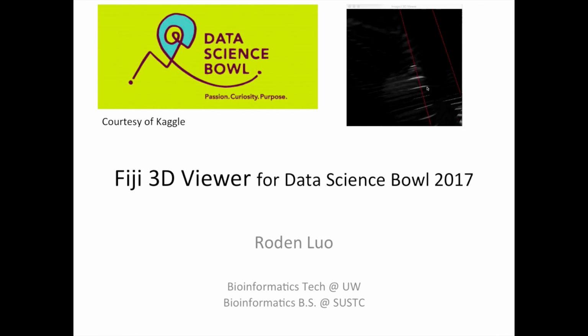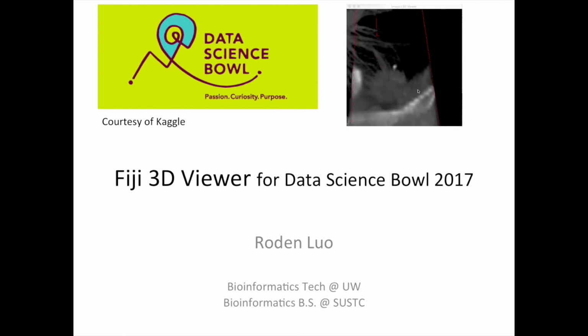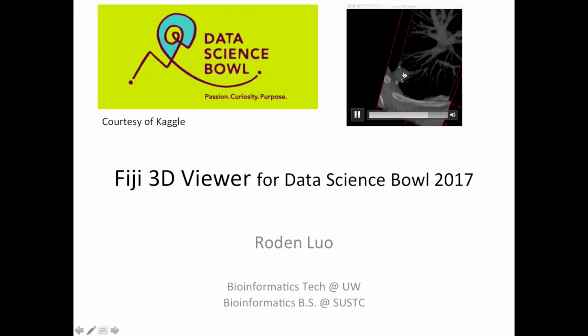In this video, I'd like to show you a 3D viewer for Data Science Bowl 2017. The final result looks like this. Here is the nodule.